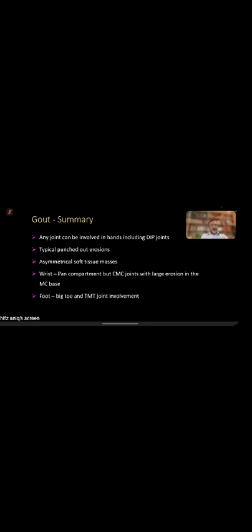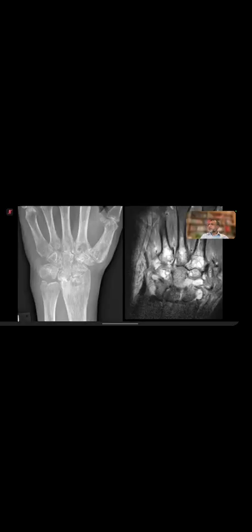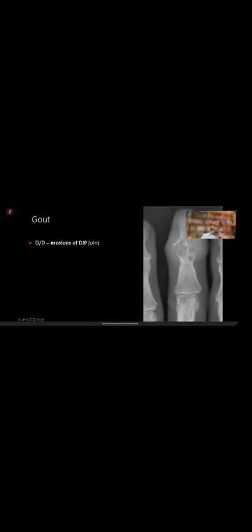So any question about this? Let's take the question here. Which thing are we talking about? Joint space? No, not really. These ones, because it is destroyed, it's not narrowed. It is destroyed by the gouty tophi. There's no matter of preserved because it's been eaten up by the crystals.